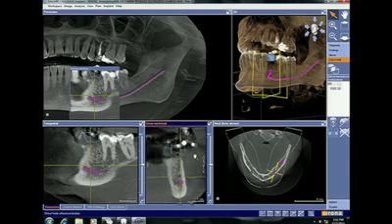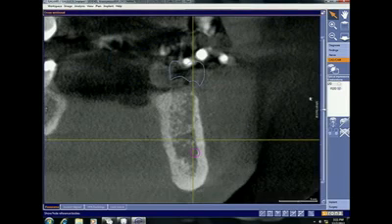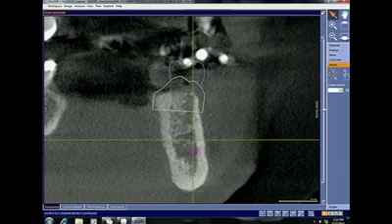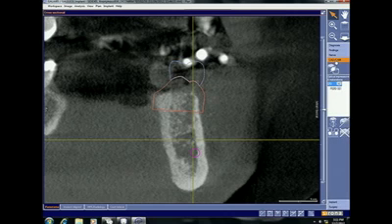And look at the crown in the cross-sectional view. And we can see the outline of the crown here relative to the anatomy. When I toggle on the model, you'll see the thickness or the biotype of tissue that I'm working with relative to the hard tissue here. Within the software, we have multiple ways of placing implants. We can certainly use the Implant tab, as you see here on the right-hand side, to initiate the implant placement. But since we've actually integrated a CAD/CAM file, there's an option to do the same thing within the CAD/CAM tab.